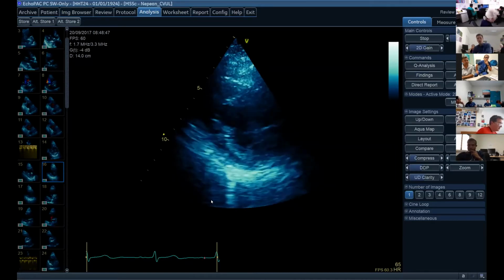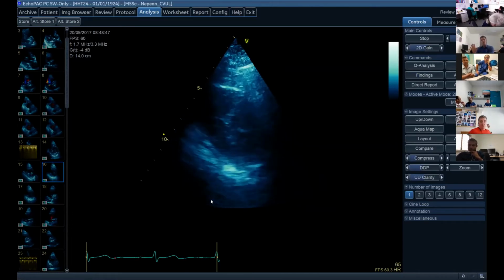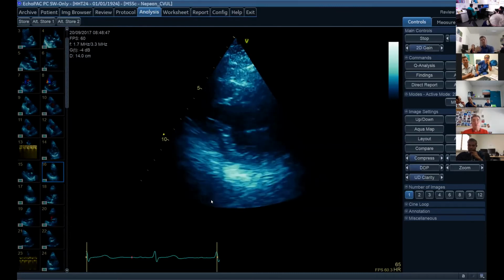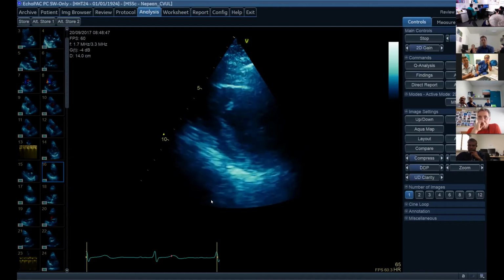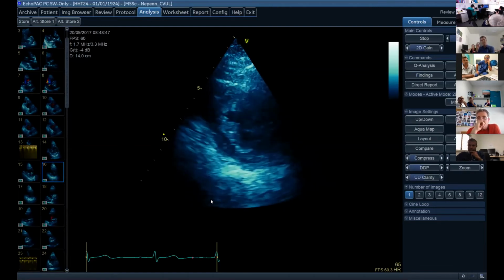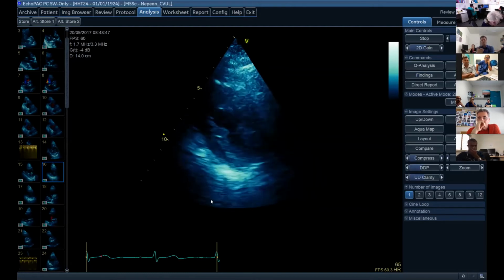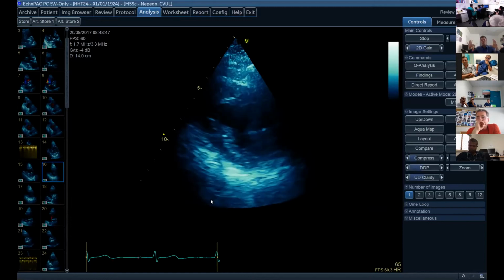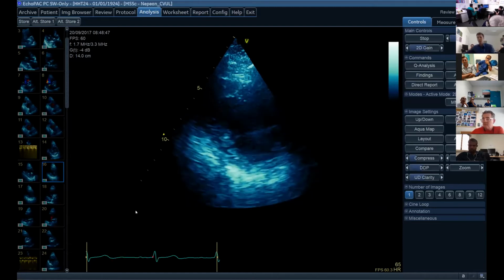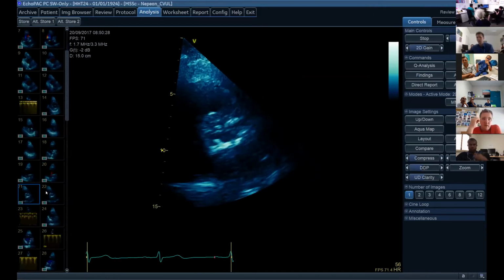Yeah, cool. So it becomes really important that we try to get an idea of what the stroke volume is with this patient. Each case that we're going to give will have a general direction that we want you to go in. And if we're showing you a valve, you've got to take into account the hemodynamics. If we're going to show you an LV that's completely blown out and not moving, and the aortic valve looks like that, or maybe I can show you a better picture than that. Maybe I can't.